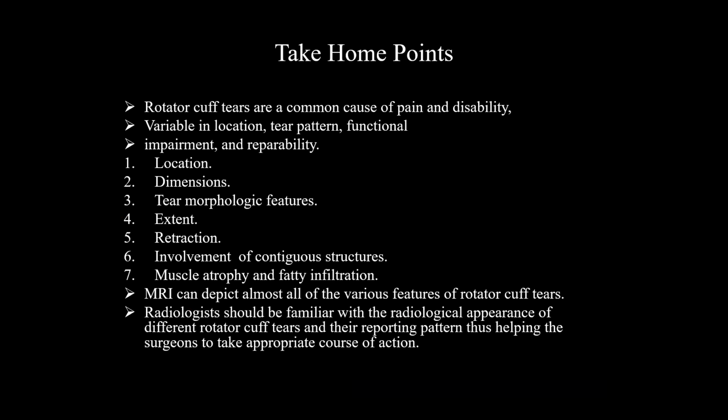MR can depict almost all of the various features of rotator cuff tear. Radiologists should be familiar with the radiological appearance of different rotator cuff tear and the reporting pattern, thus helping the surgeon to make appropriate course of action.